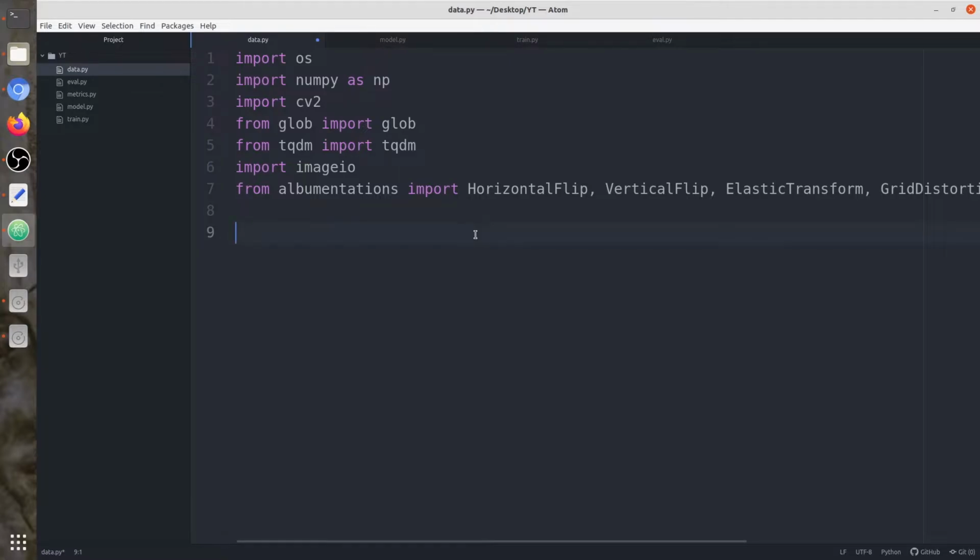First we will start by creating a function called create_dir. This function takes a path and creates a directory if that does not exist. We are giving it a path parameter, or argument, you can say. We are going to first check if that path does not exist, os.path.exists.